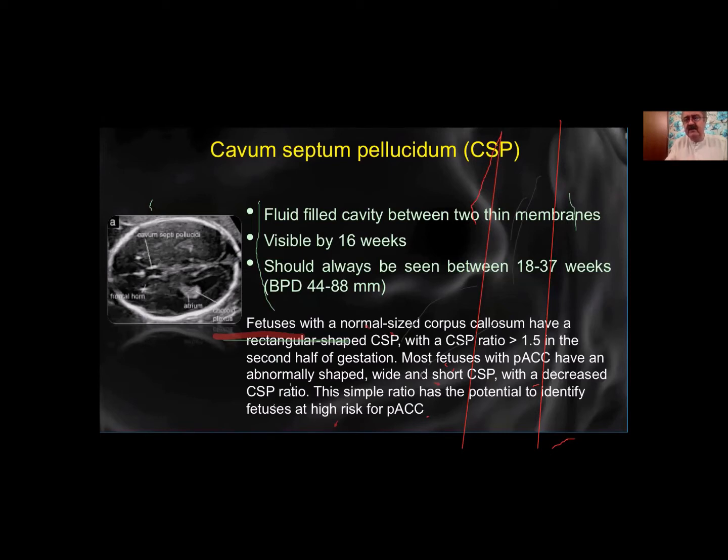And then by the time the patient gets a conclusion, she's 26 weeks of gestation, which is sad. So what is this? The corpus callosum is marked in the brain by a cavum septum pellucidum, which is this space here. And it's located in the front of the brain.